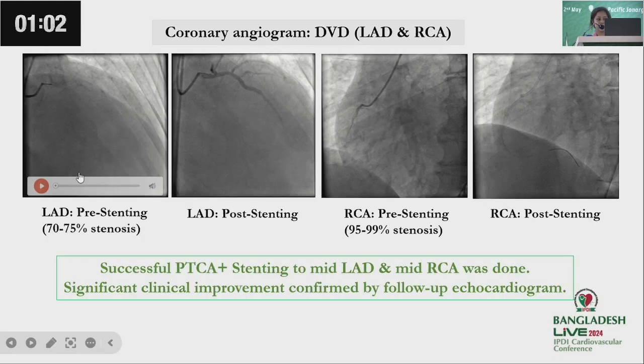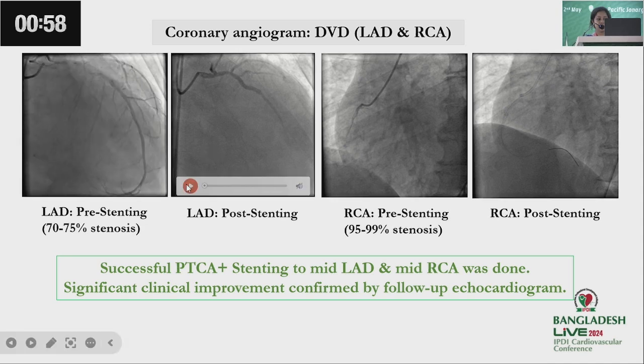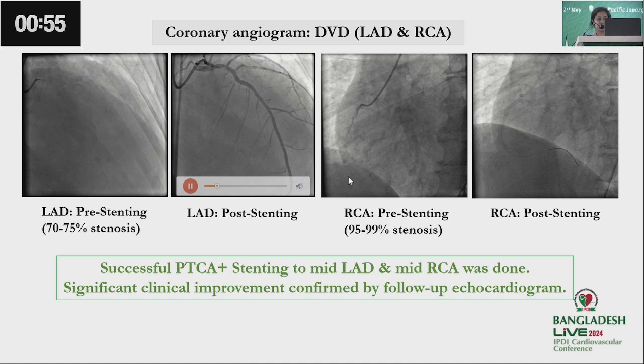This patient after that underwent a coronary angiogram. On angiogram, there was 70 to 75% stenosis in the mid-LAD.